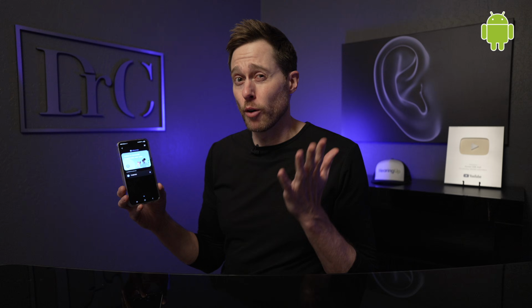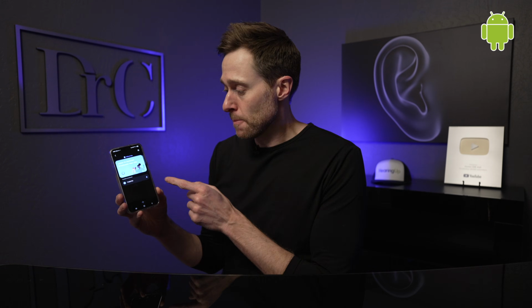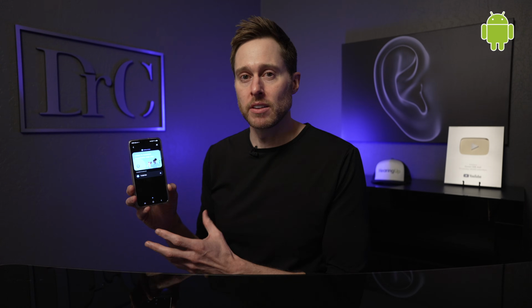That one there is actually my Starkey Edge TV streamer that I have hooked up to my TV downstairs, but it is an available broadcast. So if you're someone who is not directly paired up with my TV streamer, you could access the broadcast of that audio and stream my TV directly into your Starkey hearing aids. Again, something you can only do right now with an Android device that has Auracast capabilities. You cannot use this with Apple.